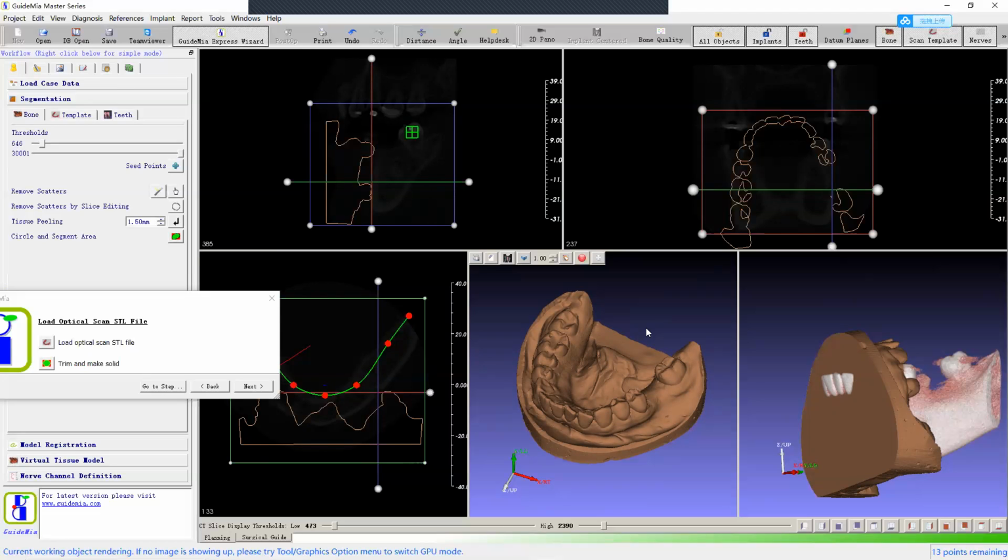We say 0.15, 0.2, 0.3. And here is the thing for the voxel size. There are two values. One is the native value of the machine. The scanner itself, its physical capability, is only, for example, 0.4, right?